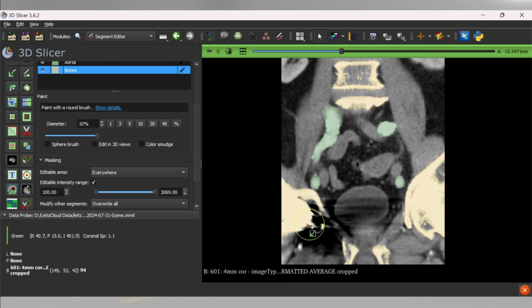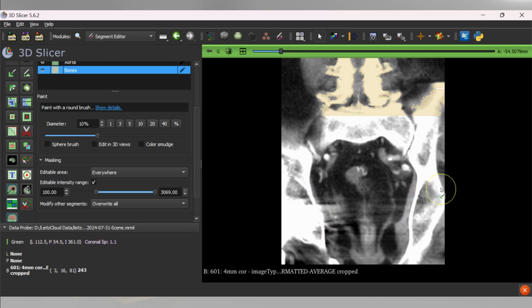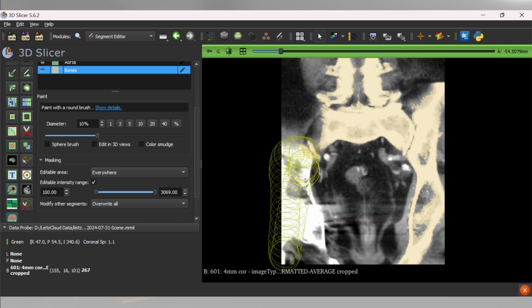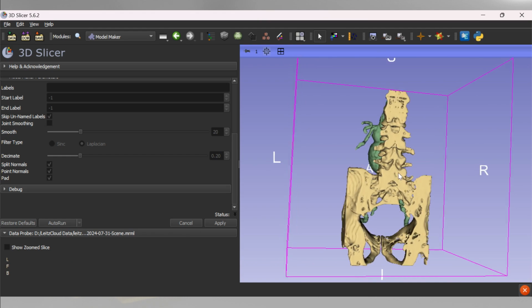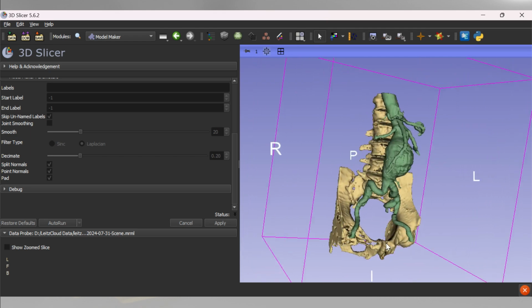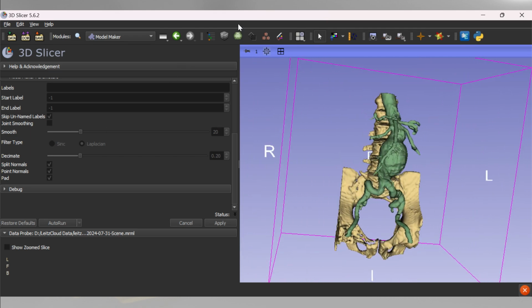The final rendering of the segmentation shows some defects that have to be removed before sending the data to the 3D printer. The aneurysm is, at this stage, still a solid body, and has to be converted into a hollow vascular model for later use as an endovascular training tool.